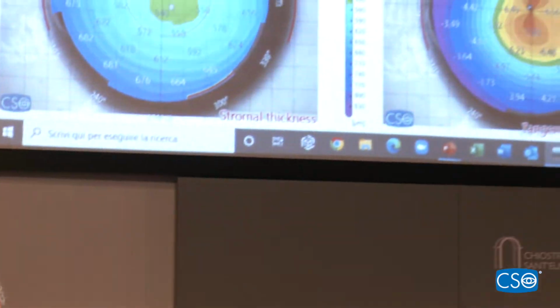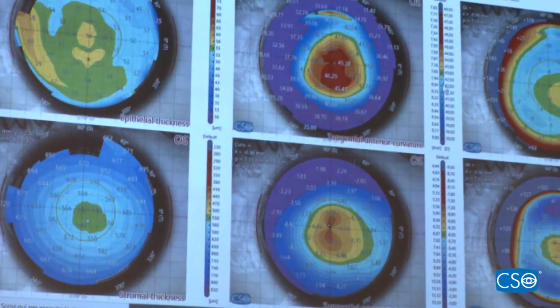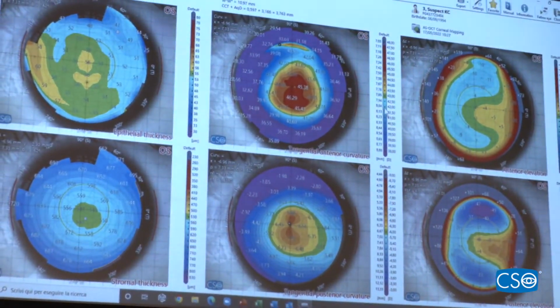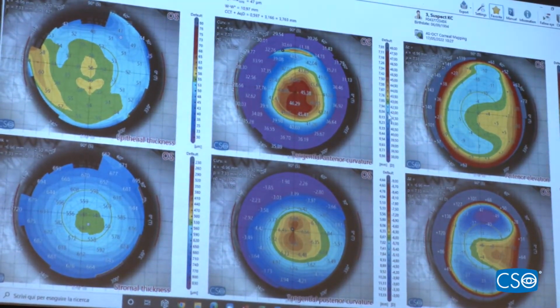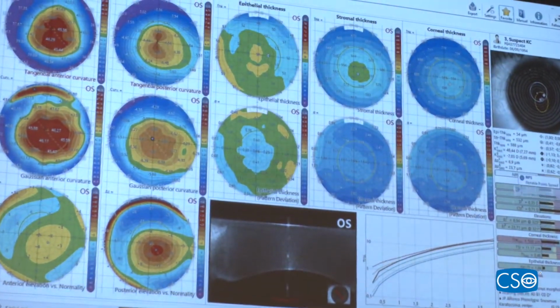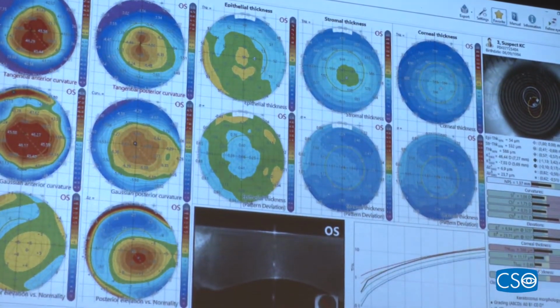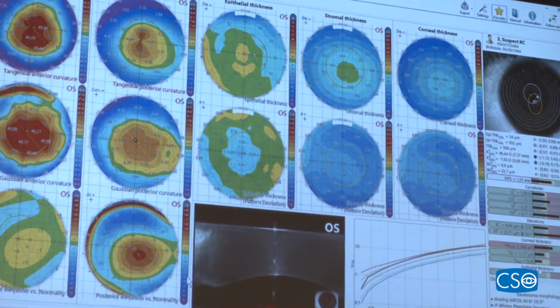Right, case number 3. I have to look at my scale here. Okay, case number 3. So we always go to the 6 map first, and we're seeing a very centrally elevated central cone. Again, they're always worrying when you have localized central cones. Those are the ones that scare me, because, well, is it or isn't it? And of course, you go to the keratoconus panel. I always check my colleagues' work over here, and my colleagues are telling me, no LASIK. And I'm going to say, well, hold your horses here. Let me take a look.